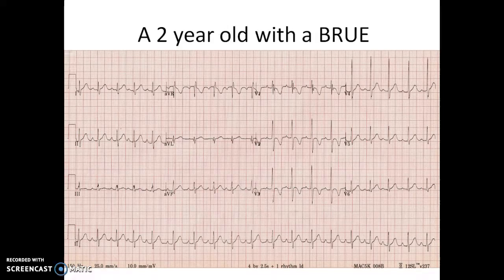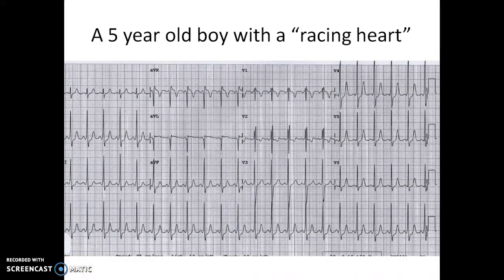Sometimes it could go into adolescence, into young adult, and we call it persistent juvenile T inversion. So it could be alarming because you would be accustomed to seeing this and thinking, oh, ischemia, but it's not. Notice the very dominant R waves in the right chest leads, getting bigger up to V4 and then reducing in size. So very good. Next one.